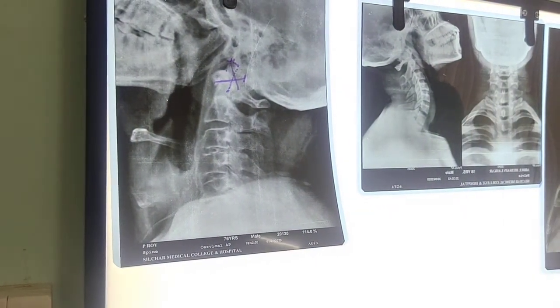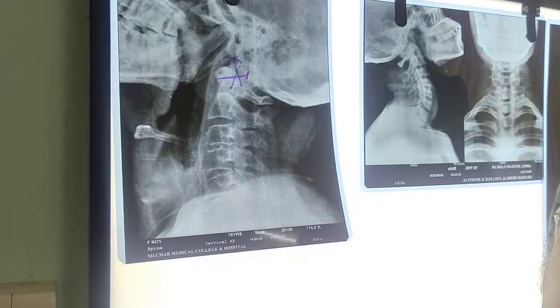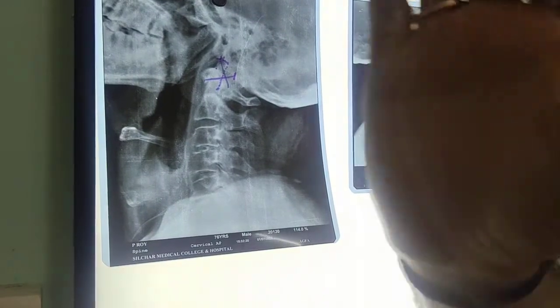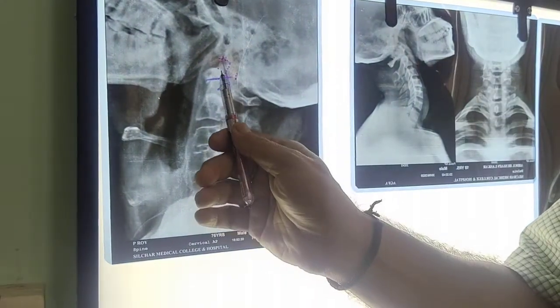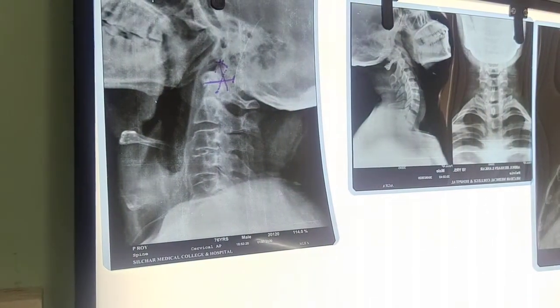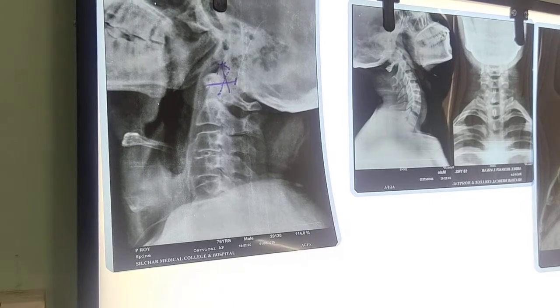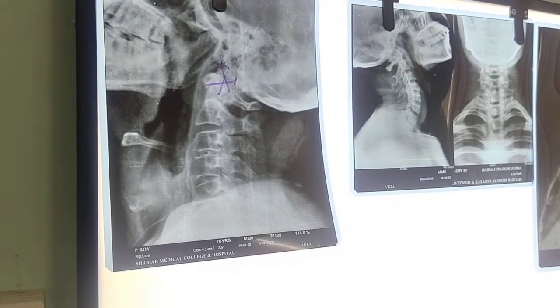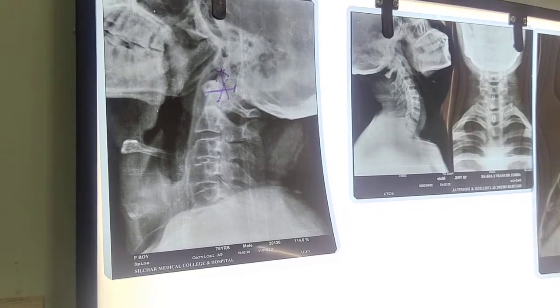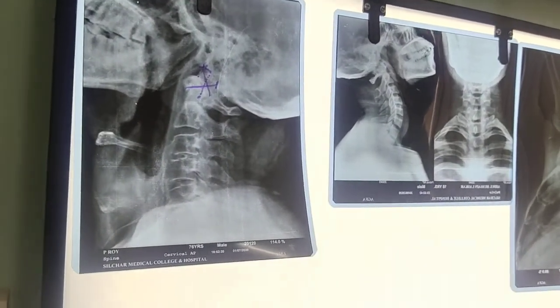In X-ray, and of course CT scan, it says it is 8.5 millimeters like that. So this is equal. In a situation when there is a fracture of the odontoid process, or there is a dislocation of that part, probably this relationship is lost. It is clear now? Now the third point is called ADI and PDI.